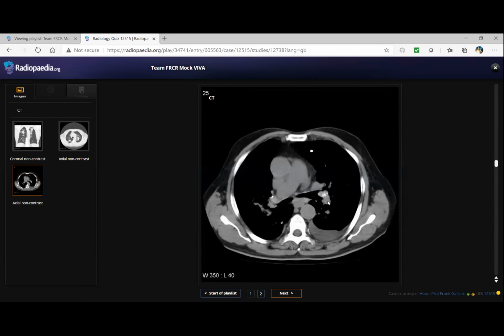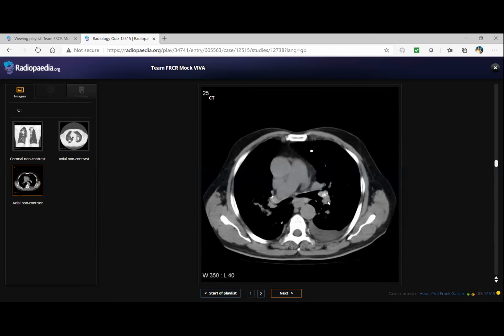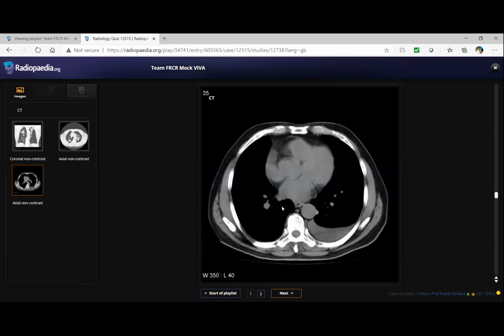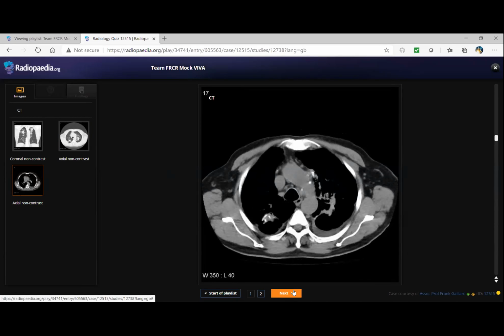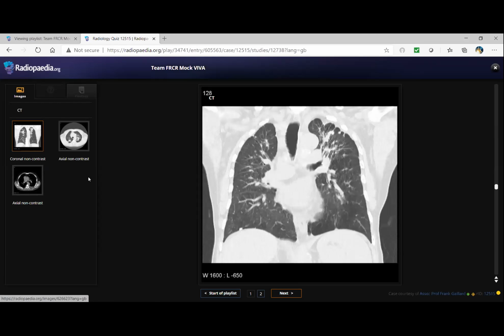There is a left side pleural effusion. Also, I can see some calcified mediastinal nodes, and there are some calcifications in the right side fibrosis also. So silicosis is my differential, and I will ask for any history of exposure to dust, refer this patient to the respiratory team, and also inform the occupational disease team for further investigation and management.